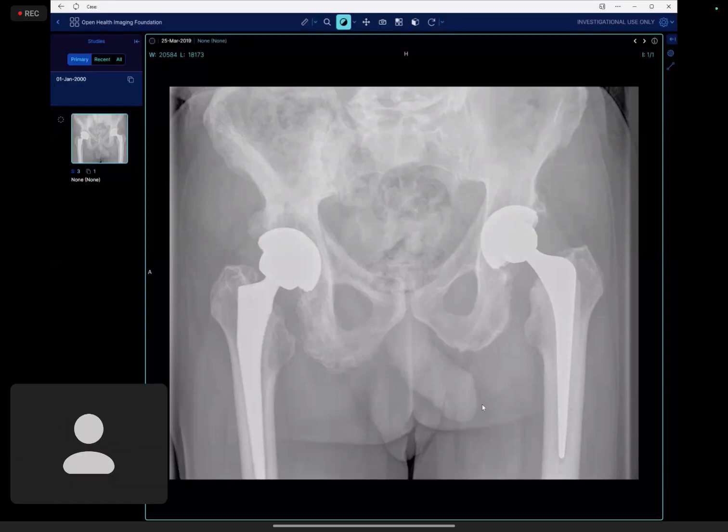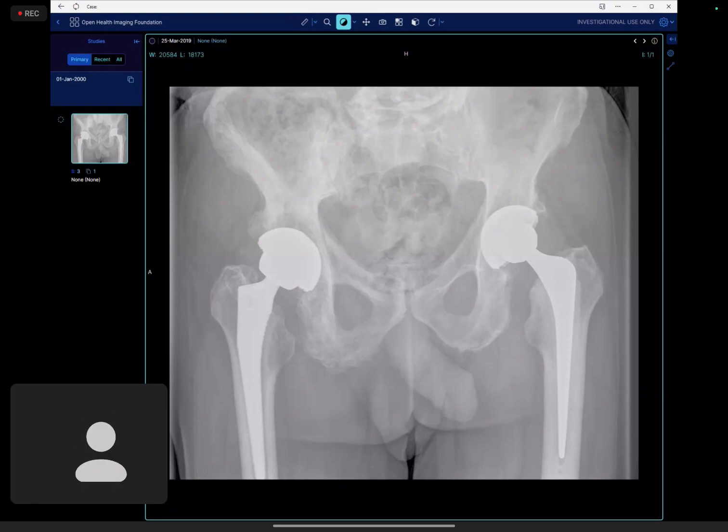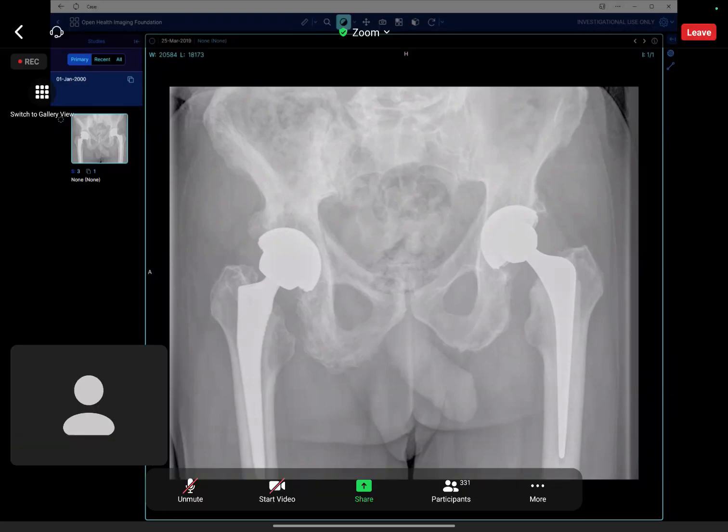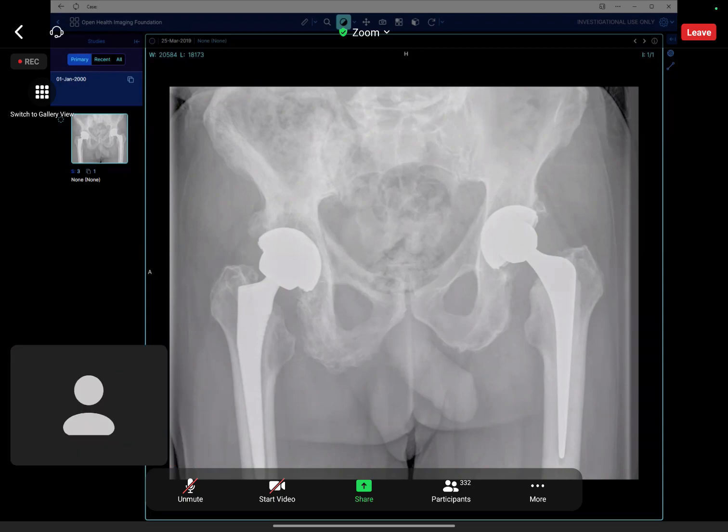Okay. So, is there anything else that you would be worried about? Yes, if this patient had known Paget's disease, I would still compare with the previous radiograph to see whether there are any changes. There is osteosarcoma formation in Paget's disease. So if the patient is having new pain or worsening features, then I would recommend further imaging. What further imaging? I think an MRI would be suitable.